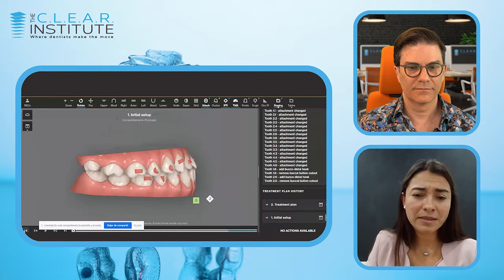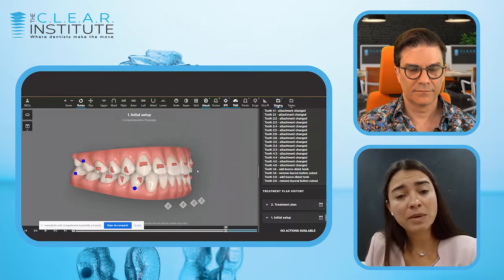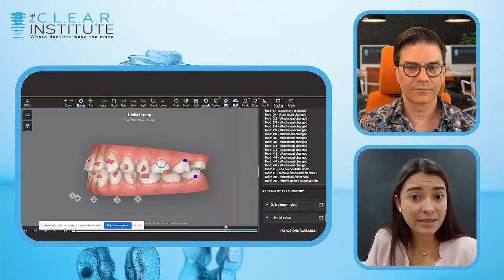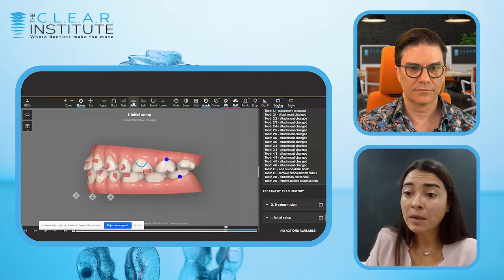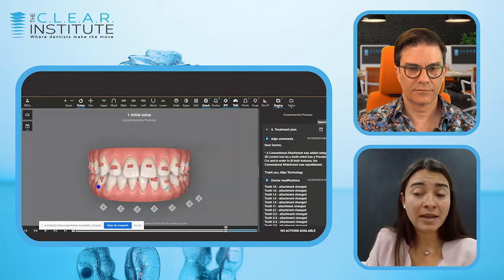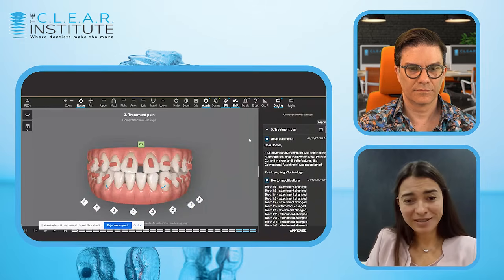We can comment on lots of things about this initial setup, but let's remember that it was done by the software with the assistance of a dental technician, and for that, it's very good. But if we apply all the knowledge that we have, we need to make a few changes.